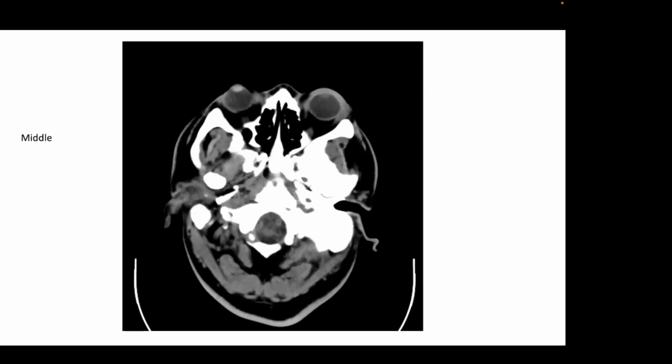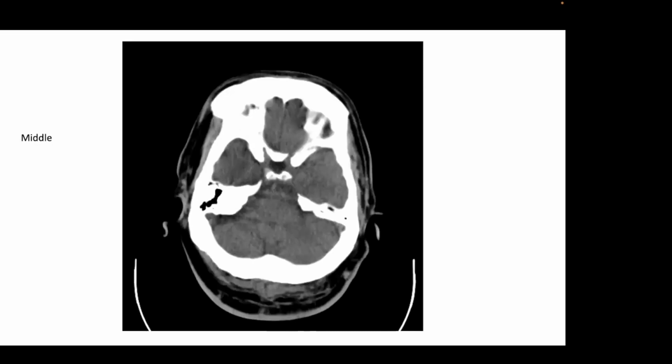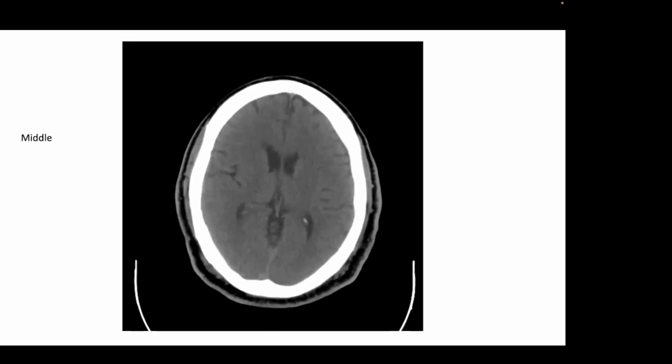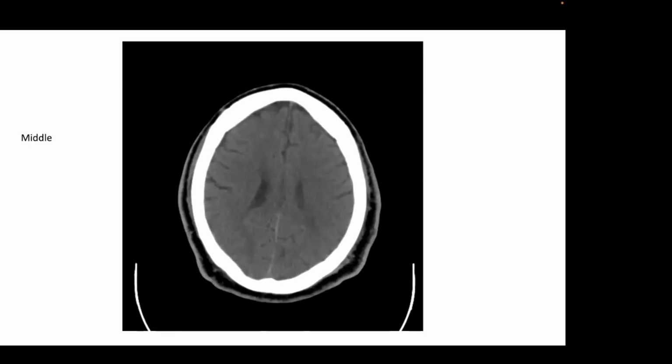Let's look at this case. Here's a CT scan. And what I want you to notice here is, I'm sorry, let's go back. Sort of gave it away there.